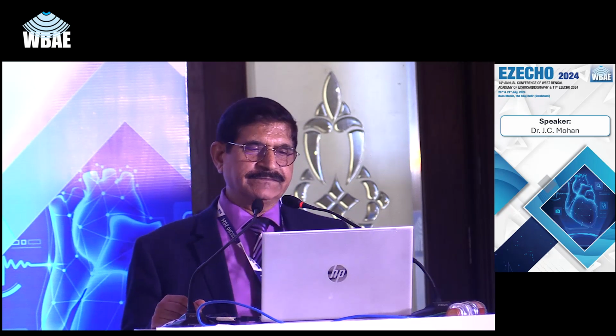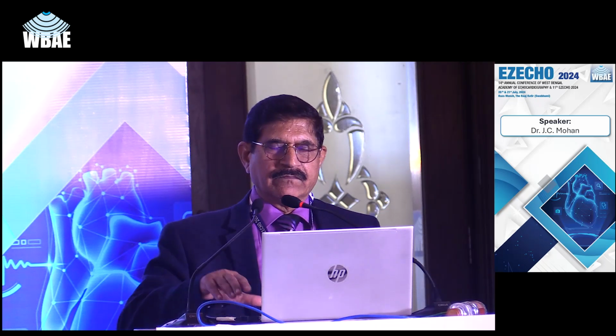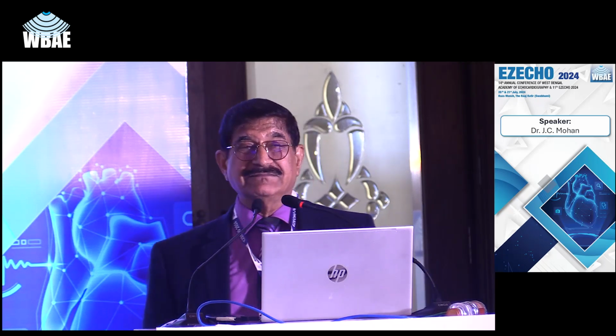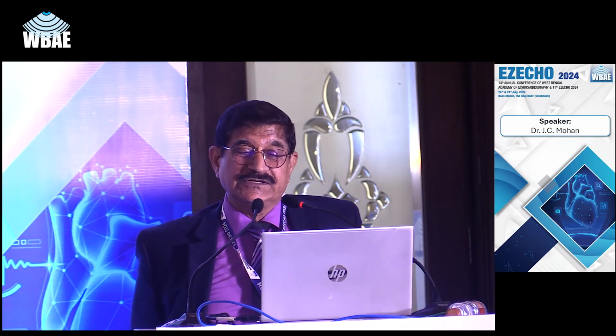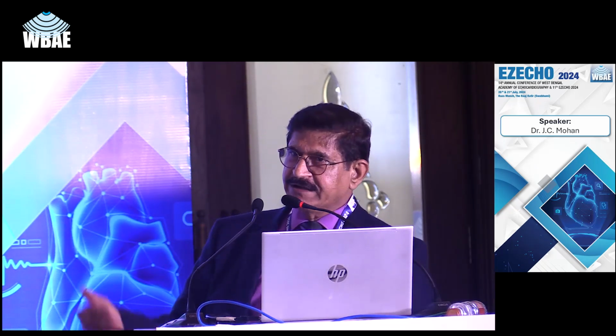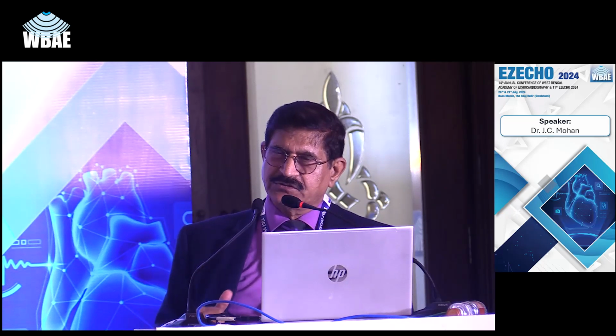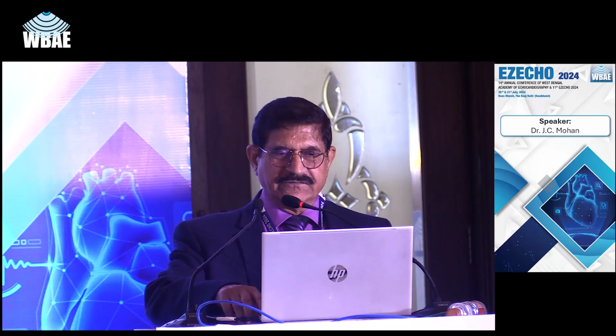Now you can see the septum, the distal septum is significantly thickened, and of course the ace of spade appearance on the right side. You again see the left ventricular ejection fraction 64%. But since there was a non-Q myocardial infarction, evolved anterior wall myocardial infarction on ECG, a coronary angiogram was done which only showed some plaquing. Look at the ECG shown at the top. Try to compare that with the angiogram. The angiogram shows a normal left anterior descending artery, nearly normal right coronary artery, and circumflex artery.